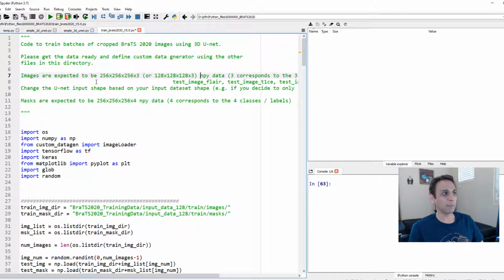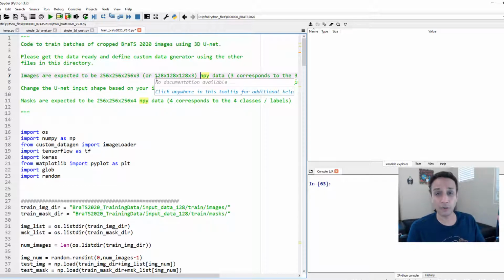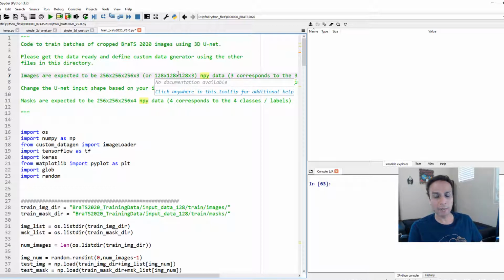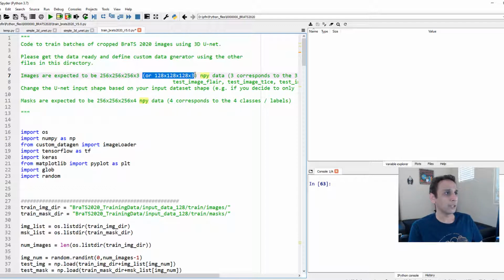Again, I was experimenting with various of these, and I took some notes right there. So if it says 256 by 256, it can be 64 for you if all of that doesn't fit into your memory, right? So work with whatever size you think you can handle. Also try Google Colab to see if you can work with 128 by 128. Sorry about the bookkeeping in the middle, but these are important things.